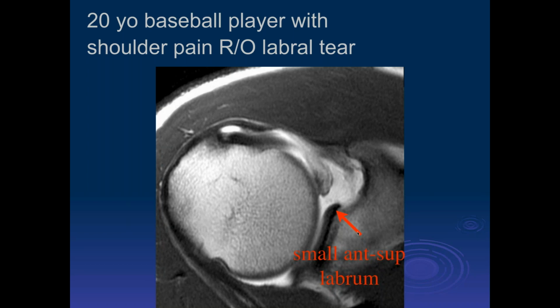What's the variant we're talking about right now? So I don't see a cord-like middle. There's the cord-like middle glenohumeral ligament. Okay. But what's wrong with it? So this would be a Buford complex with a tear of the IGHL.